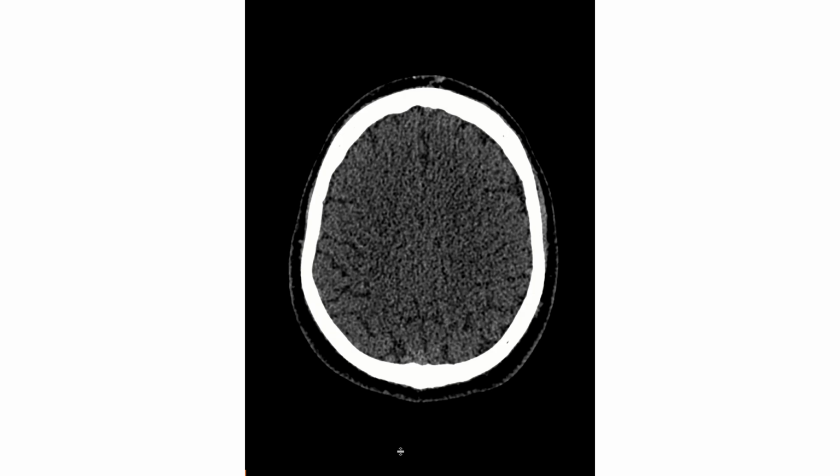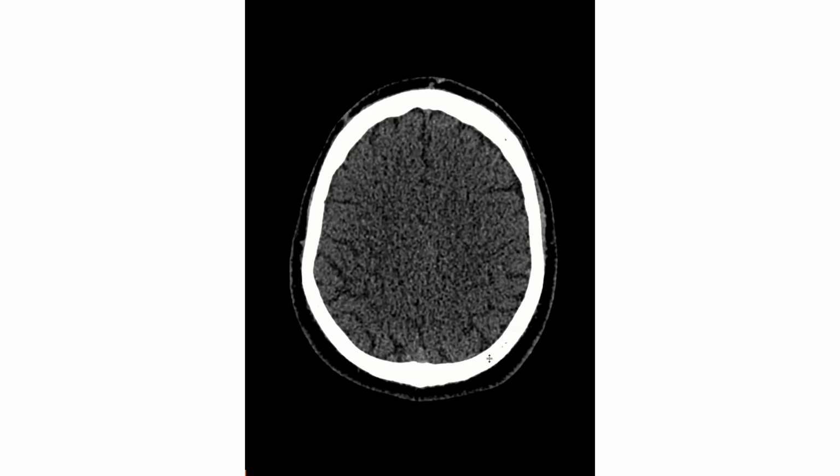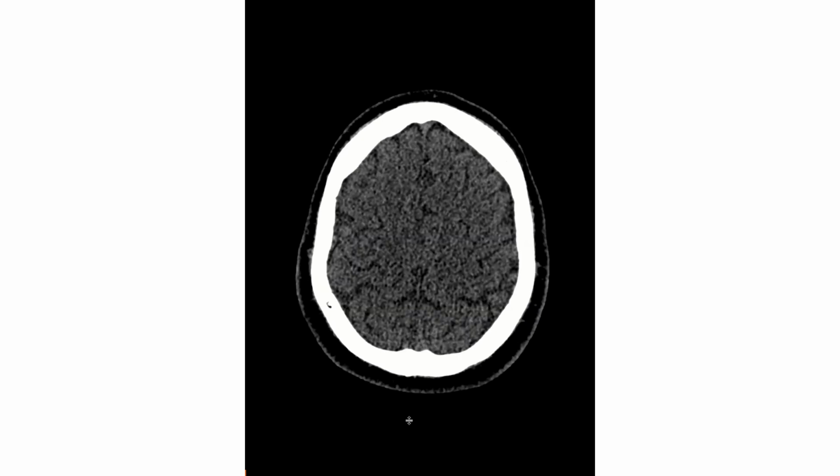We need to know that we have soft tissue windows, or basically here we're going to have brain window, and then we're going to have bone windows, and then we have different reconstructions. This sequence basically is the axial head CT, and then we have different reformats that are usually done by our technologists in sagittal and coronal reformat, and then we're going to go over them as well.